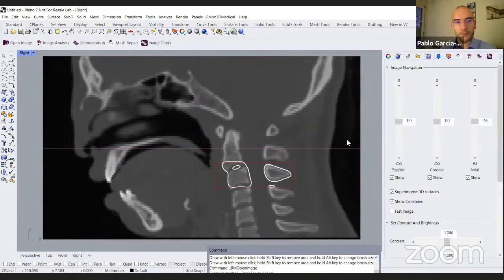You can absolutely print it, and it will fit on the vertebra. Be careful when you print it to put the support over the part that is not touching the vertebra, so that there's nothing to polish. Of course, a doctor is needed. Yes, absolutely.